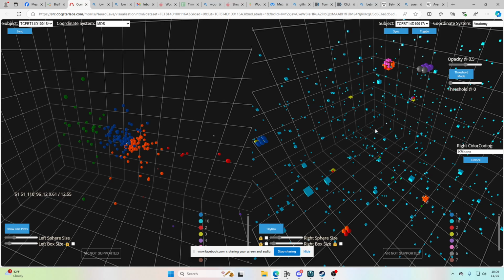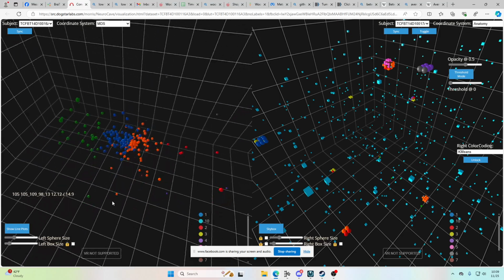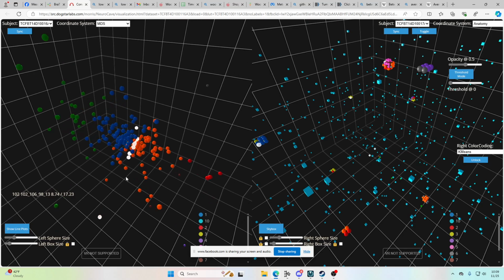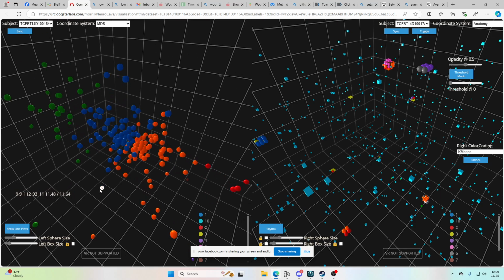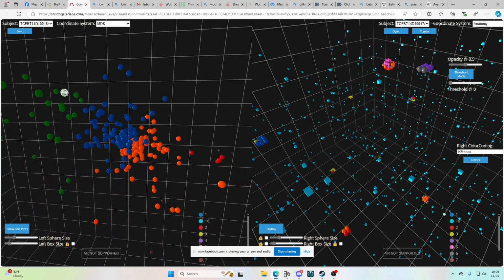So I had a three-dimensional data set, and I used a three-dimensional MDS, multidimensional scaling, dimensionality reduction algorithm to display it. My interface lets you hover over these cells and it highlights them. The data set on the left corresponds to the tumor data set on the right.